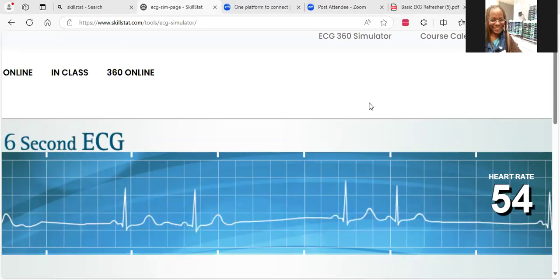In the center of my screen, I'm looking at about 1, 2, 3, 4, 5, 6, 7 of those boxes. So that's going to be over the time we need for counting this as just a regular arrhythmia. We're going to count that time in between those complexes as an arrest or a pause.